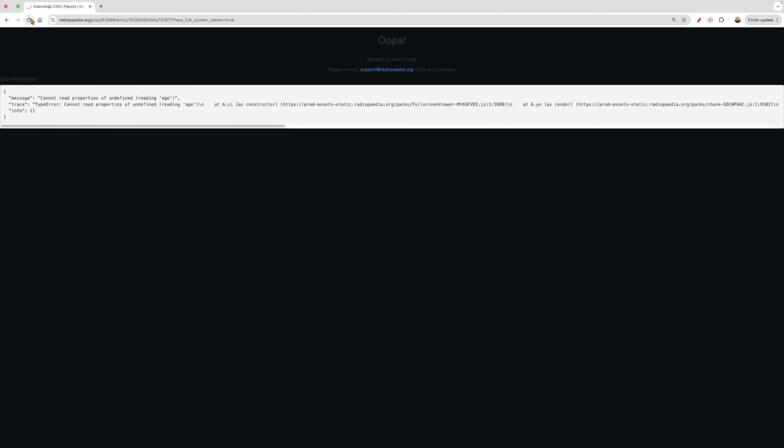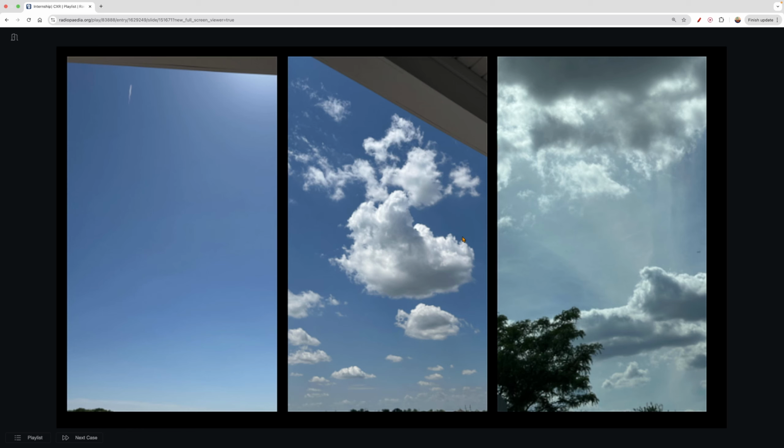Let's reload. All right, and so this was just the same idea. Now that we know all that consolidative material we were just looking at, we have the normal again, and now we were able to appreciate how this big old fluffy cloud in the lungs was making it difficult to see the normal anatomy. Now let's talk about this one, right? This one, we just know there's something there.